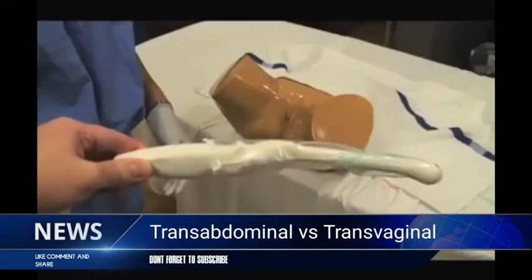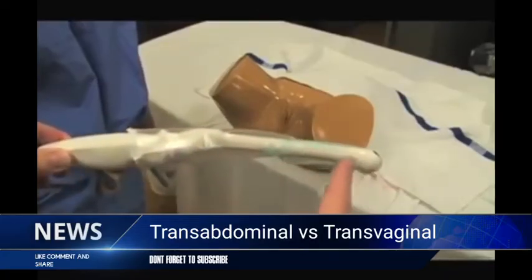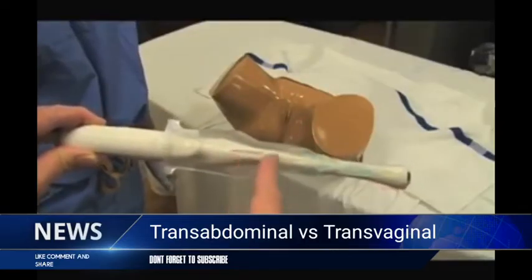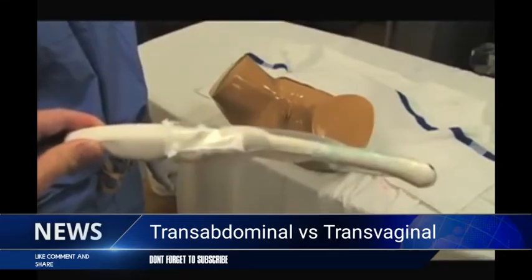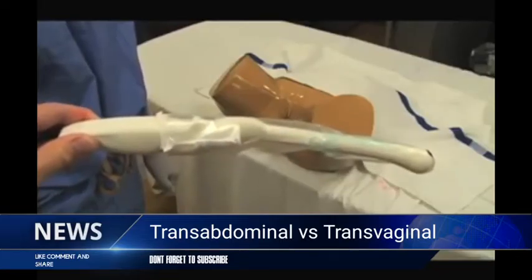Here's the endocavitary probe that we'll be using for the GYN exam. Notice that it has a slight curve to the tip, and we'll use that curve to best visualize the adnexa and structures on GYN ultrasound. I'm pointing here to the notch in the top of the probe that is the indicator or marker dot on the probe, and that'll match us to the indicator dot on the ultrasound screen.